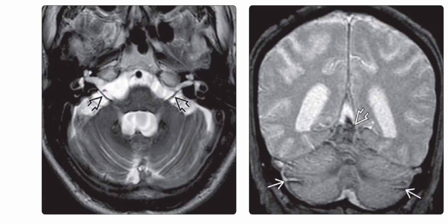Left is the axial T2 weighted MRI in a 60-year-old male with progressive ataxia and bilateral sensorineural hearing loss. It exhibits the superficial siderosis, which is seen here as thicker and blacker along the 8th cranial nerve. Note the cerebellar atrophy with large fourth ventricle and prominent folia. Right image shows that sometimes the superficial siderosis is limited to the posterior fossa.